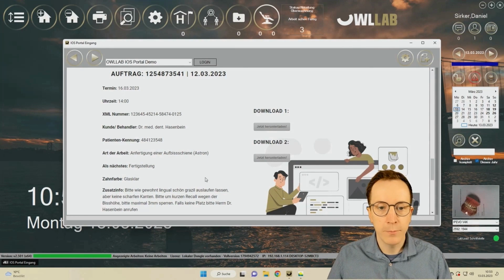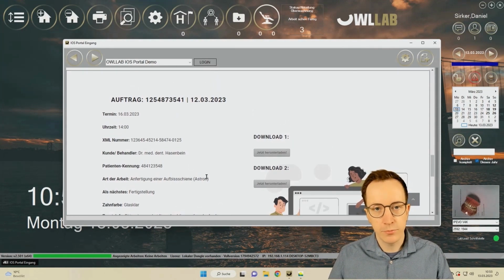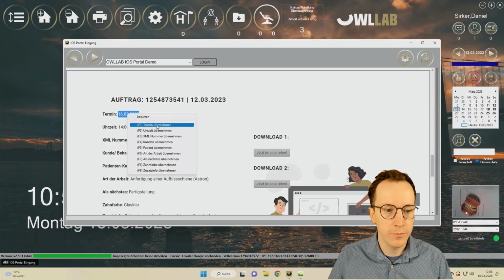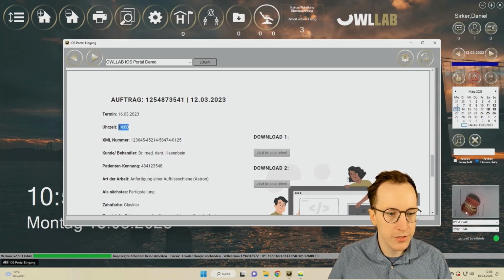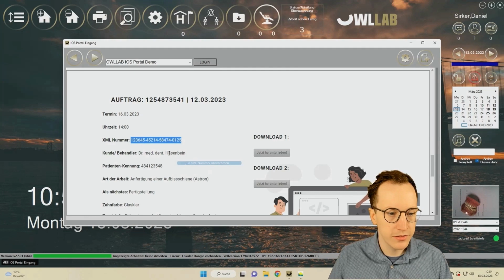And fundamentally, I merely gather the information I need at this specific location. And as I said, sometimes it's a bit scattered, but that doesn't matter. That means I go in here, say this, it fits my appointment. I would like to take this as a date for my new order now. This is my time. The order number, of course, is specified. We take it directly. This is my customer.